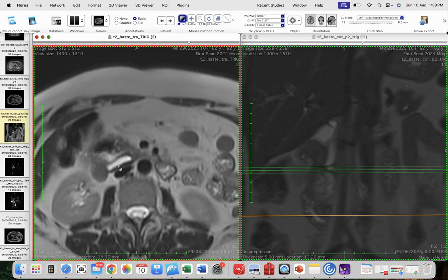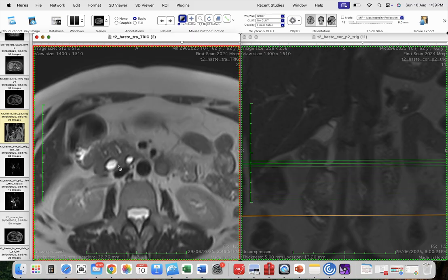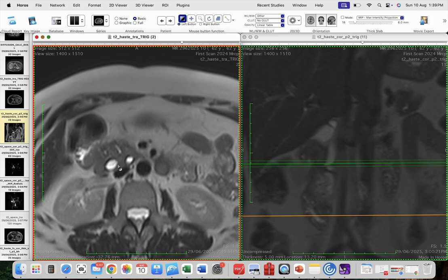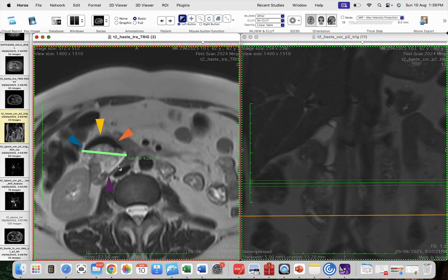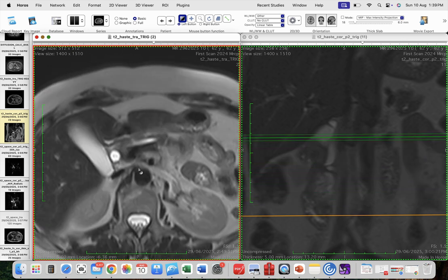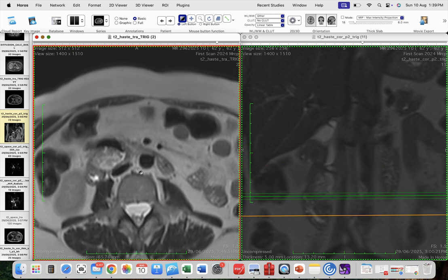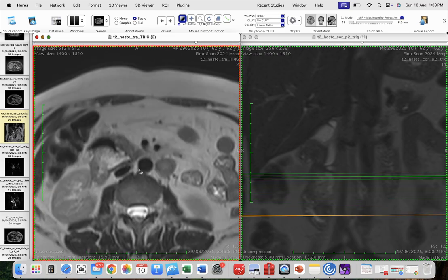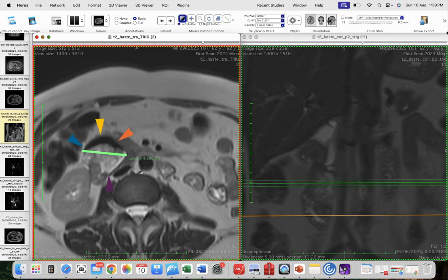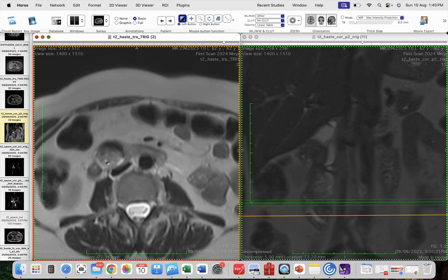So be careful and always look for a duodenal diverticulum at the second and third parts of the duodenum. It is somehow not common, but you will see it frequently, and it will help you resolve a lot of diagnostic problems in many cases, like this case. This is a diverticulum confirmed by the air-fluid level.